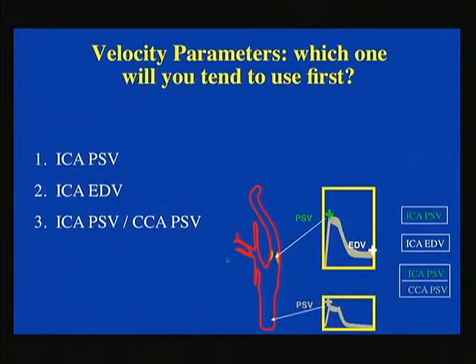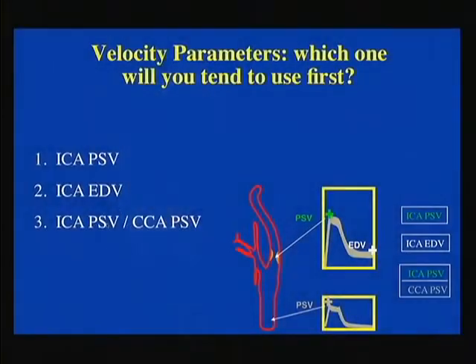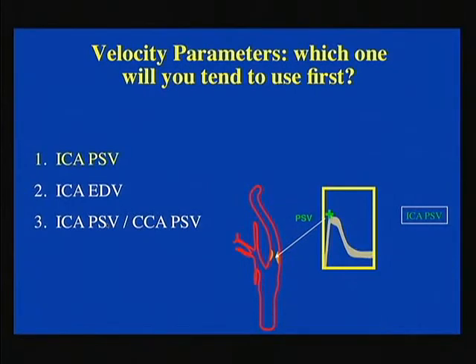Now, question becomes, overall, which is the most commonly used velocity criterion for making a diagnosis of carotid stenosis? These are your three options. When we survey people, and when the ICAVL, also called ACAVL, surveys different laboratories, the majority, almost unanimous, come out with the peak systolic velocity. That's the velocity criteria we believe in the most, the one that's more robust, supposedly.